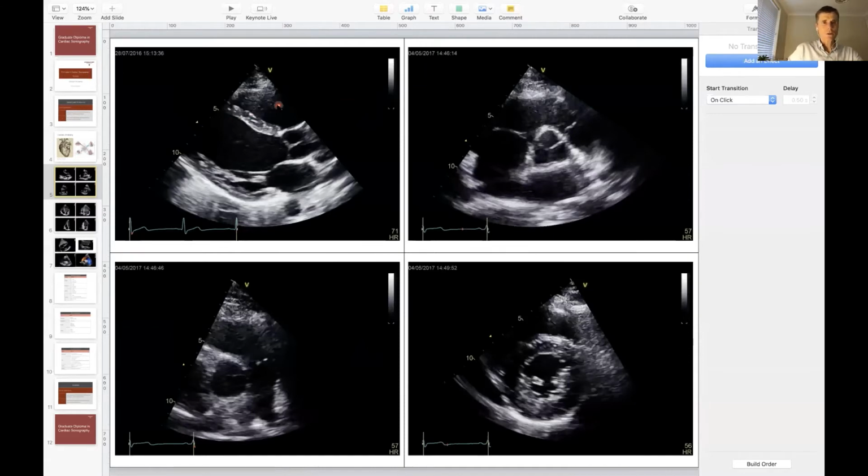So, parasternal long axis view, the very first one. At the top here, the most anterior of the chambers is the right ventricular chamber. We go over here to the next one. You can see part of the right ventricle as well. We can see what's called the right ventricular outflow tract, a curved structure here, and it can be appreciated, the right ventricular outflow tract here too. This bottom image, which isn't as clear as perhaps I'd like it to be, shows the right ventricular chamber, the more oval or crescent looking chamber here.